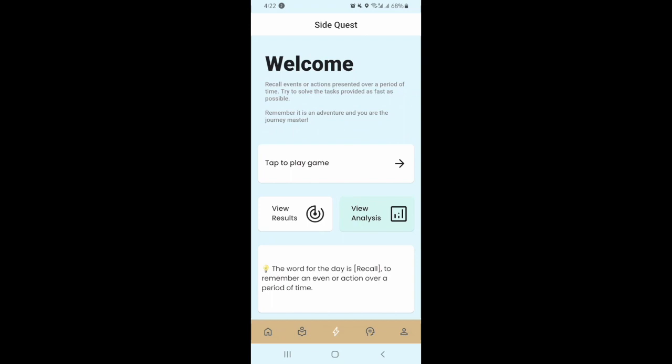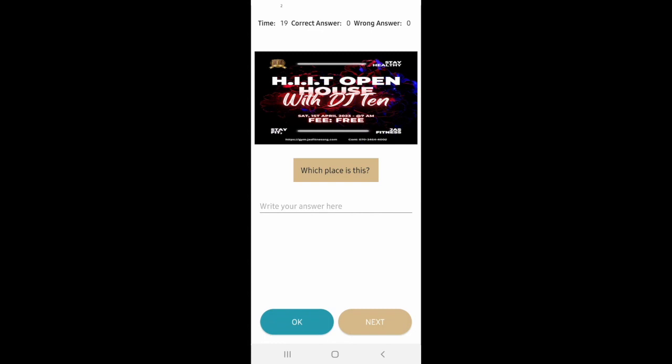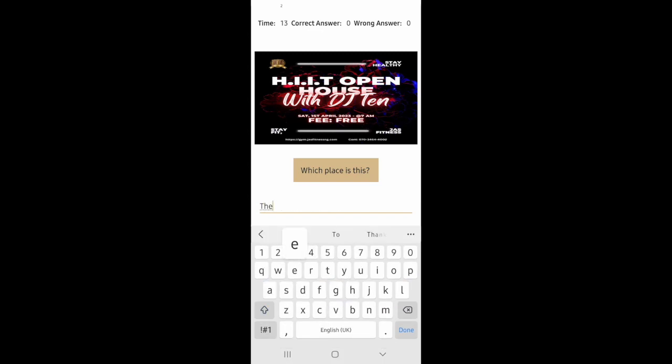So let's just play a short game. So as that loaded up, we're being timed. So what is this place? This is the gym. So I have to be really quick. The gym, academic. Oh, I'm almost out of time.